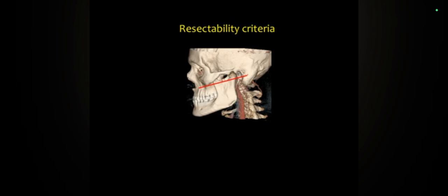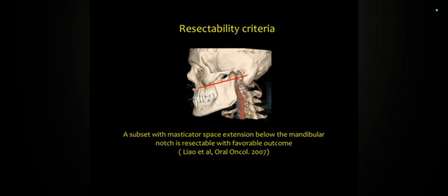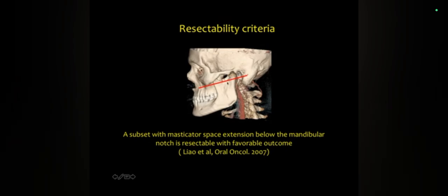The only two areas where the acquisition may change the whole thing are the larynx, where you have the thyroid cartilage and the paraglottic space, and the sigmoid notch. So there, if you are in doubt and the acquisition is not proper, then you use the coronal in the larynx and the sagittal for the notch. So this is the sigmoid notch. Any disease above the sigmoid notch is disease extending into the high infratemporal fossa.